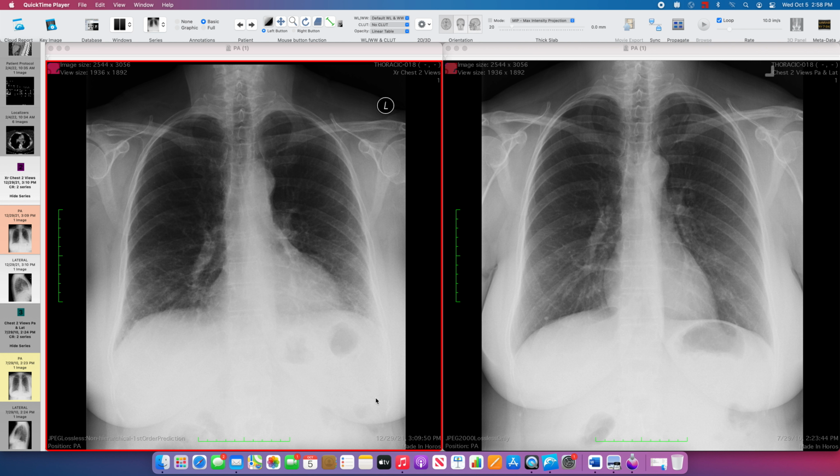This is Dr. Christian Cox, and for this case we're going to be reviewing thoracic case 018, and in this section it's diffuse lung disease. This is a really huge topic to try to tackle in one section, but I wanted to introduce you to it and some of the general patterns that we see of consolidation, emphysema, nodularity, and in this case, interstitial lung disease.